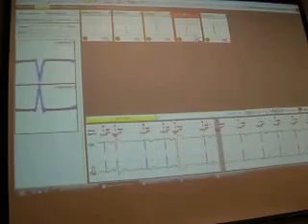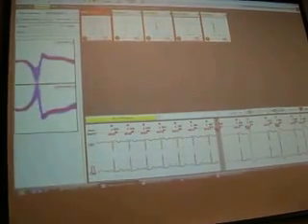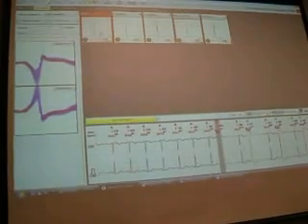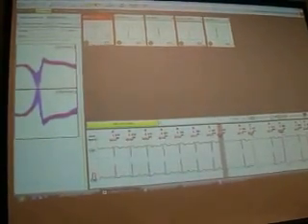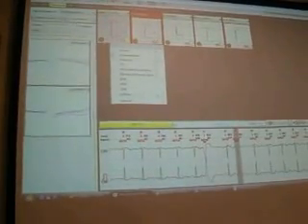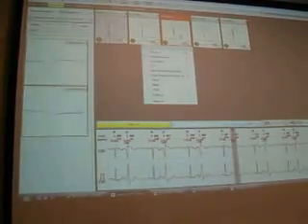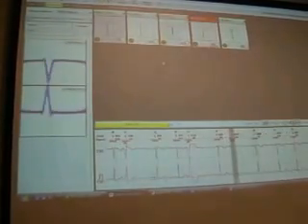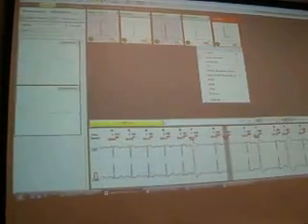I check every one of them, and at last I set the correct type. The correct type, I think this is ventricular rather than supraventricular. The next, supraventricular is correct, and then rather ventricular, supraventricular, and the last is ventricular.